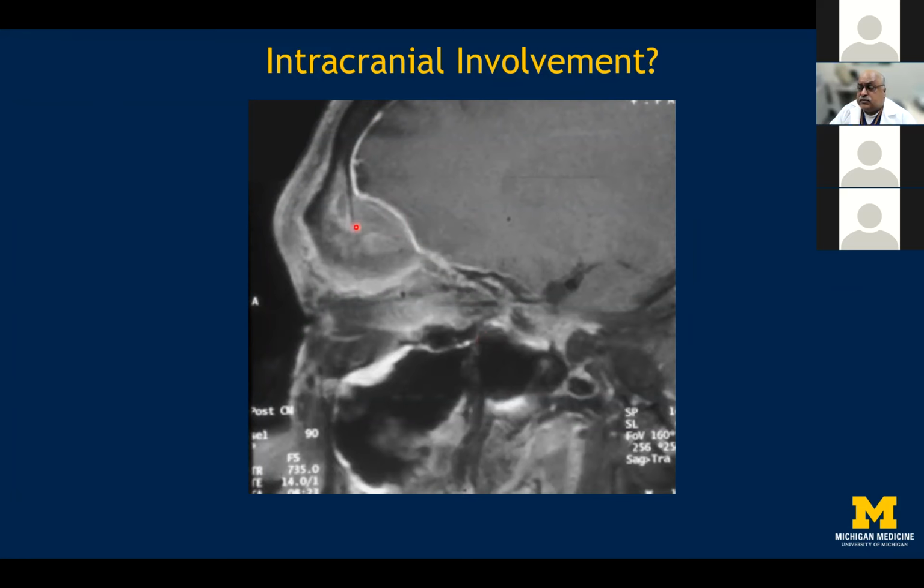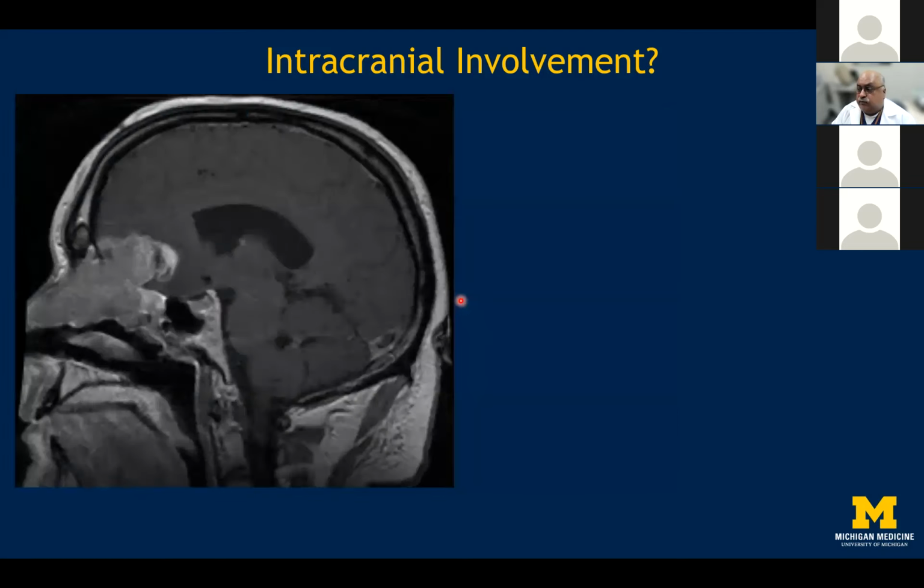You can see that there is no doubt that dural invasion has occurred. And also make sure that these spiculated areas of enhancement which you see are actually leptomeningeal enhancement, which increases the chance that this patient will have a poorer prognosis. So early evaluation of these subtle changes is important as well.